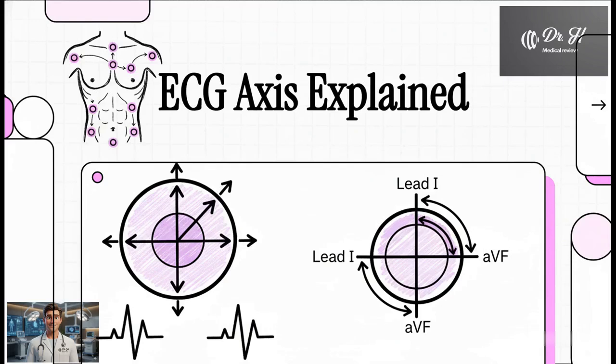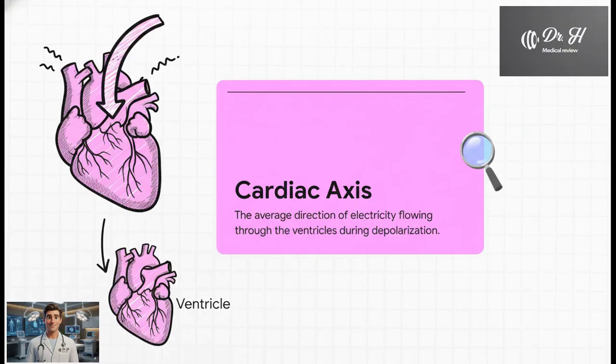All right, let's tackle one of the most intimidating parts of reading an ECG, the cardiac axis. I know, it sounds super complicated, but we're going to break it down into simple, practical steps. Stick with me, and by the end of this, you'll be calculating it in seconds. So what is the cardiac axis, really?